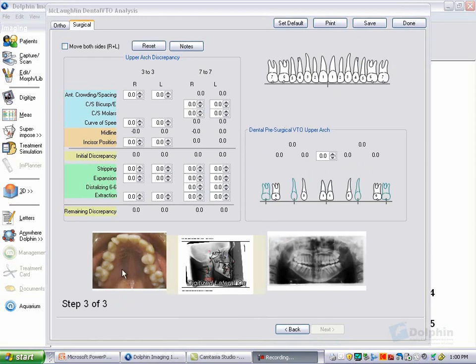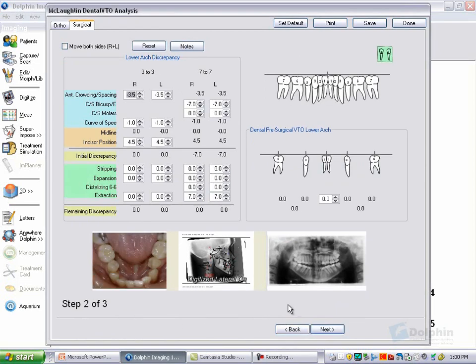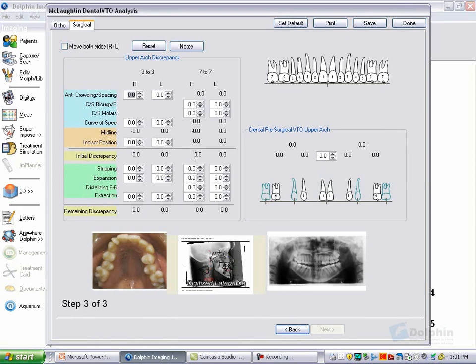You can see that that is actually labeled as step 3 of 3, and I referred to this area as the third chart, but it's actually the third page that we're using, but it's in essence the fourth chart that we are using.